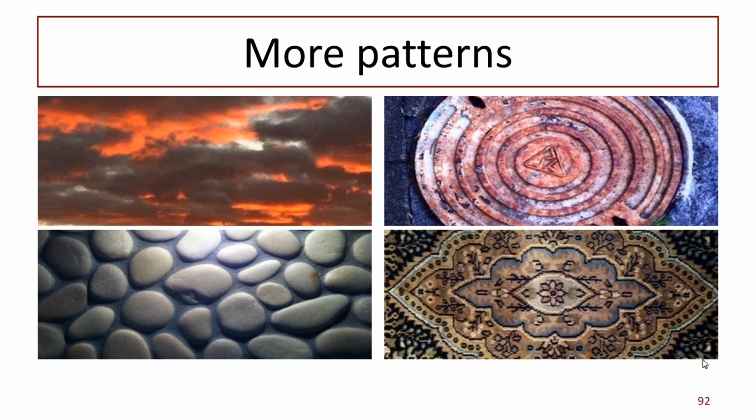So with our melanoma, we lose structure. This is made up of clods. This is made up of concentric circles, or lines joined up. And this is a very complicated pattern, but it's completely symmetrical. Here, we've lost our dots, we've lost our lines. We've just got structureless, but we've got many dangerous colours.